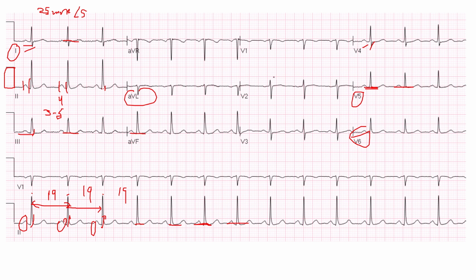Now let's come to the anterior septum. You can take V1, normal, V2, normal. This one is T wave, by the way. V3, there's some sort of changes, but we said V2 and V3 can be variable a little bit. If we see a little bit of changes only in them, it's normal. So ST is normal. Now let's go to the T wave.